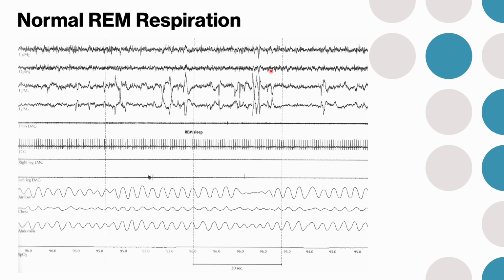Remember, this is phasic REM. Phasic REM is when the eyes are moving and you have irregular respirations. Tonic REM, like over here, has no eye clicks. Here's some more tonic REM. Right there. And in between these eye clicks, there is tonic REM.